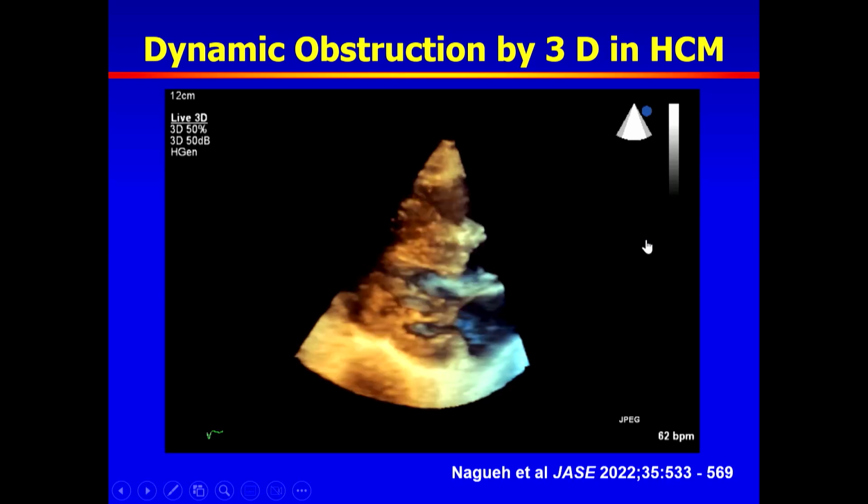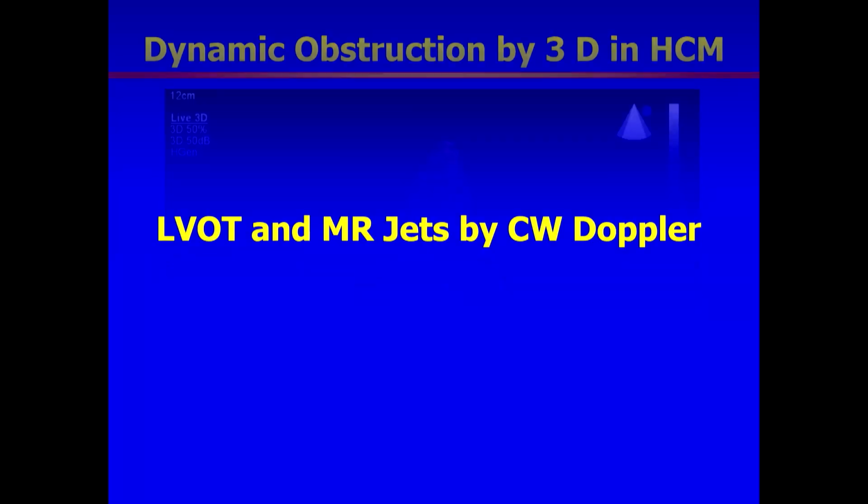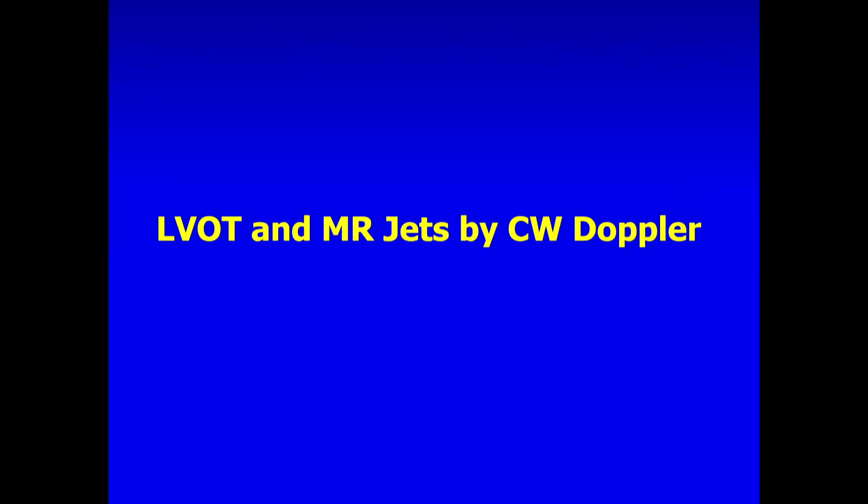3D can likewise be very rewarding in showing the presence of the SAM as you see here, and 3D allows you to get good assessment of ventricular volumes and mass in this disease as well as other diseases.